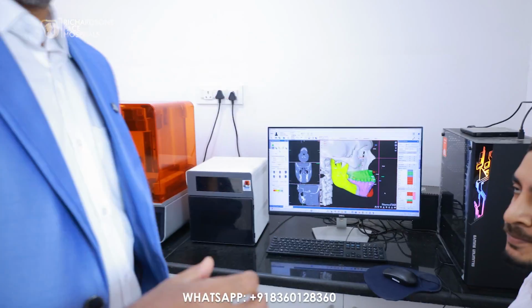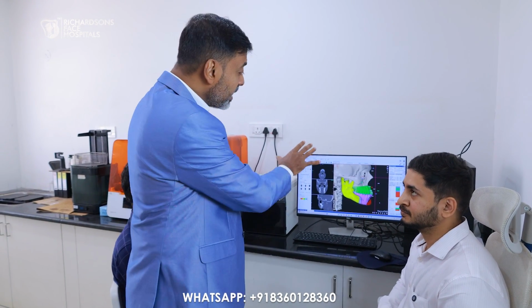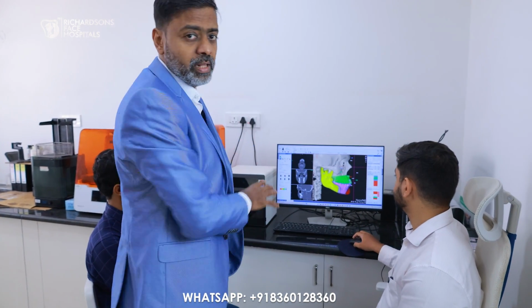All right. The purpose of this short video is so that you all understand that these kinds of complicated bijaw surgeries that we're doing are done in a meticulous manner, so that the results are absolutely precise, absolutely perfect, and they get the exact results. Also, many of these movements are very complex and very fine, where we have to take care of the anatomical structures, especially the nerves and the tooth roots and everything. And this really helps us big time, virtual surgical planning.